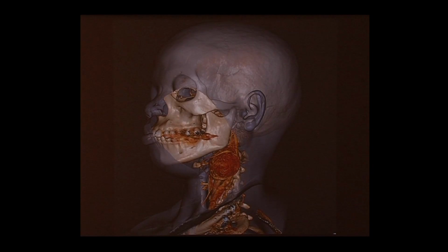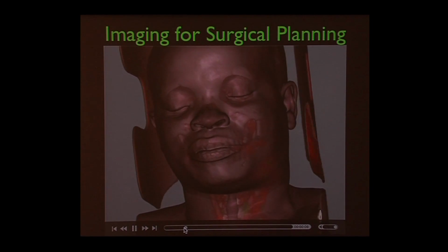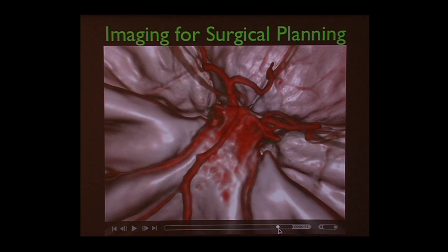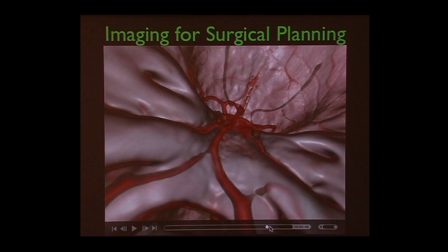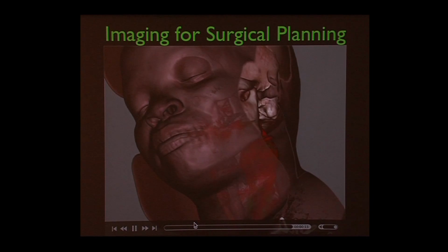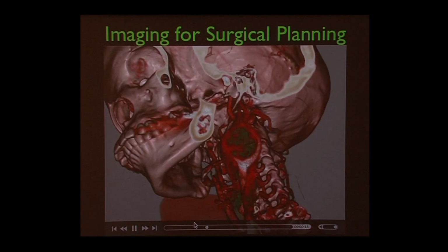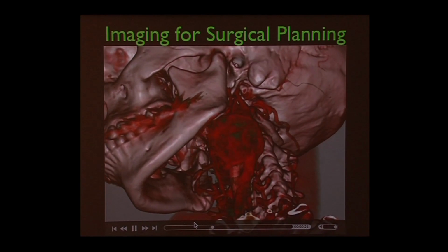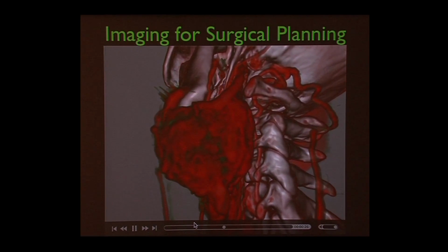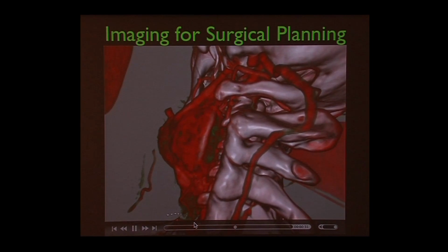What's the green? You're going to ask a colorblind person green. Which is the green? So there's green that's showing up all through these. The mass itself? Well, the colors are actually reflective of those CT numbers or Hounsfield units. But we pick the colors. We try to make it realistic, but once we pick a color, everything else has a relationship color-wise to that area because it's based on real data. But in terms of what's green, I can't tell you.